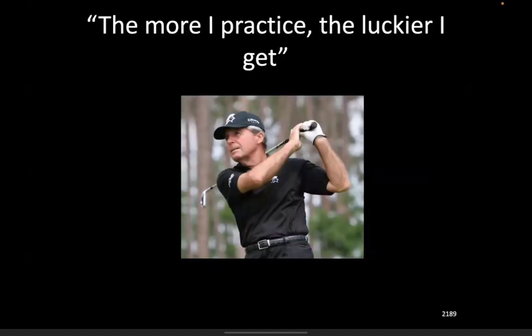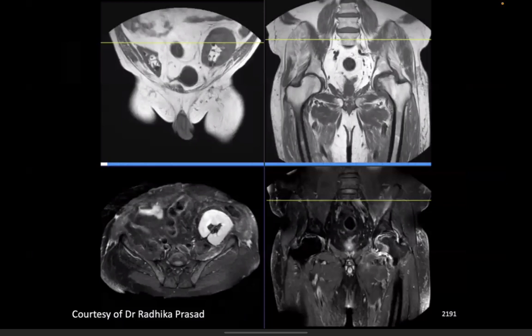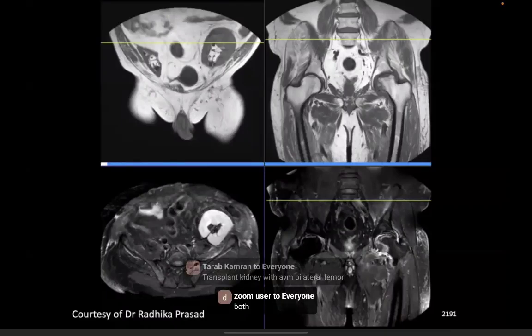The more I practice, the luckier I get. Thank you to Radhika Prasad for this one. What's the diagnosis here, guys? AVN of both hips or just one? It's actually both, isn't it?